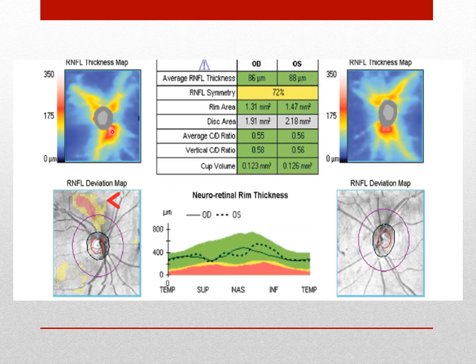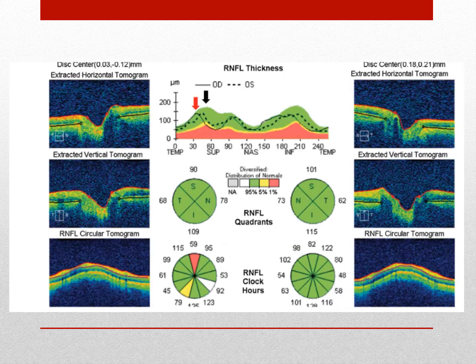If you look here, you can see because it's being rotated, the arcuate bundle inferiorly is being shifted to other parts of the nerve fiber around here, right? Remember, it's always thicker in the inferior part. So there is already some nerve fiber over here, but because the arcuate bundle is being shifted, it's added on. So that's why it is elevated here, thicker than usual. And the red is just showing that superior temporal shift and leading to a thinner side more superiorly. So that's why it's red. Okay, it's just showing here.